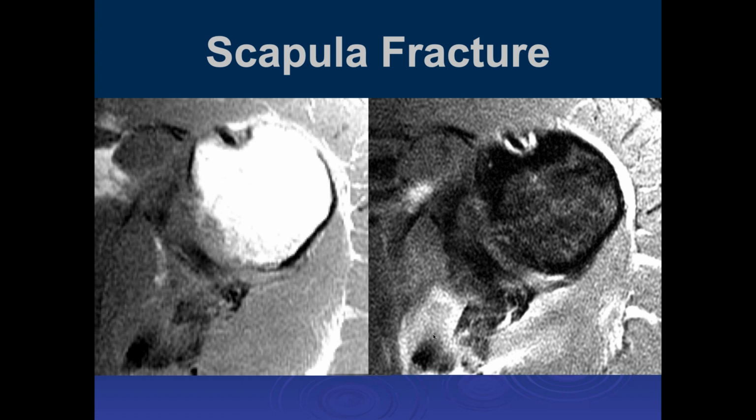Mm-hmm. I just want to point out how easy it is to actually miss these because we're not used to looking at the scapula. Well, the X-ray would show it, John.